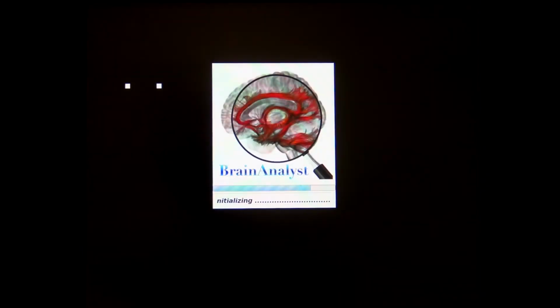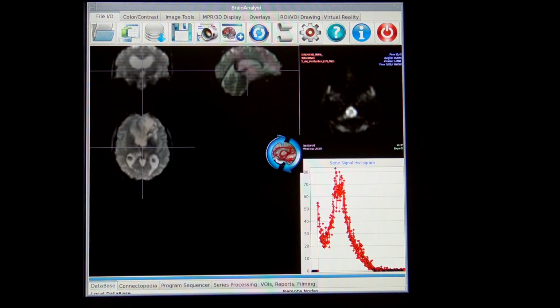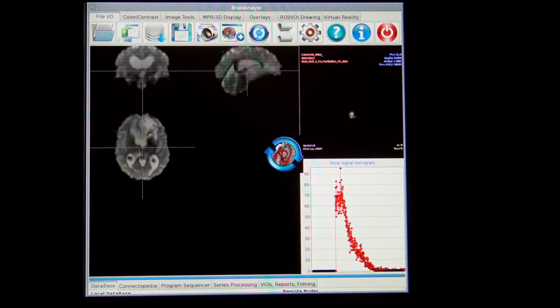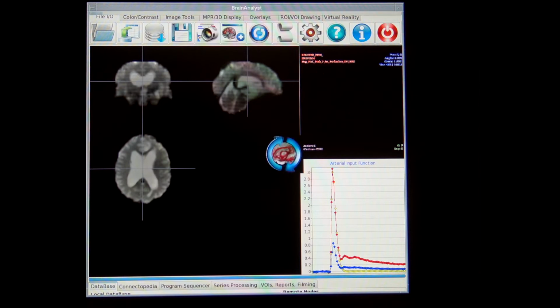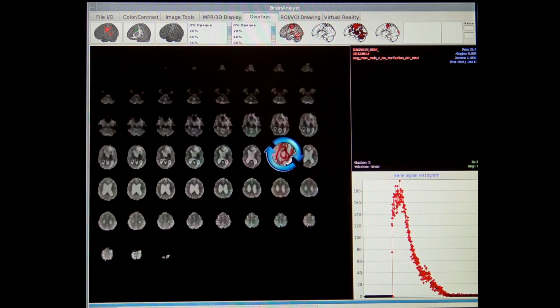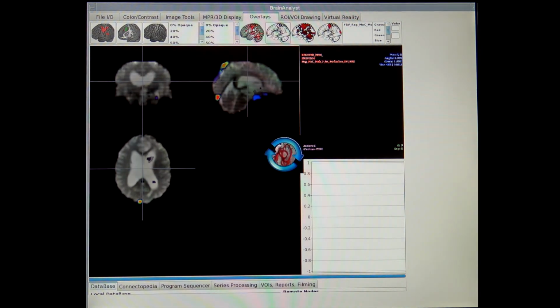BrainAnalyst loads the images, then performs a brain extraction, a motion correction and a registration to a template. It detects the best arterial input function, then corrects for contrast leakage if there is any, and estimates all the perfusion parameters: CBV, CBF, MTT, Tmax, and so on. Then it estimates the permeability parameters such as FBV and KPS or K-trans, and using FBV it automatically detects the angiogenesis area in the volume. Then it creates a report of the involved areas for the end user and saves back into the AW database all the perfusion and permeability maps in DICOM format.